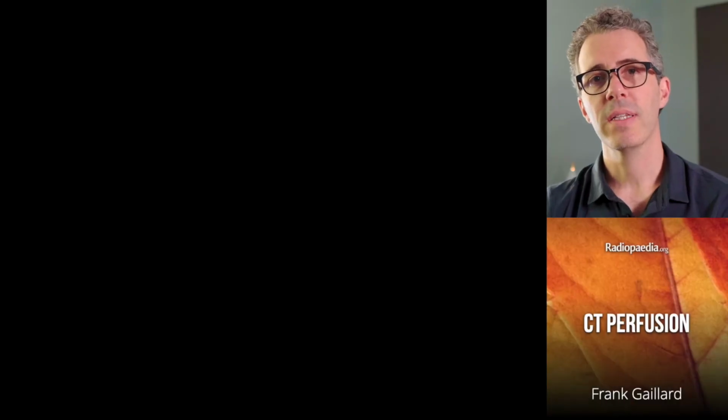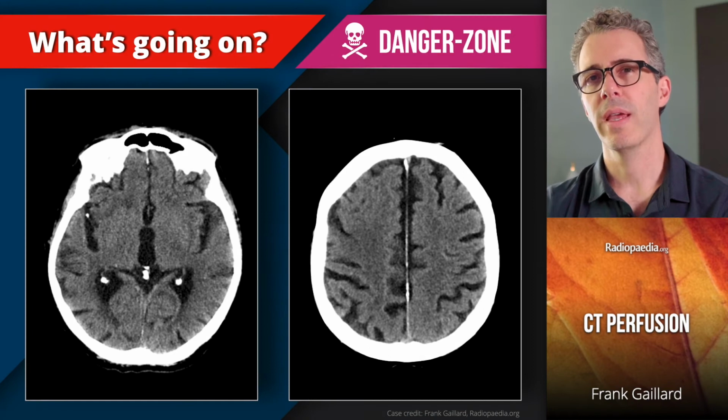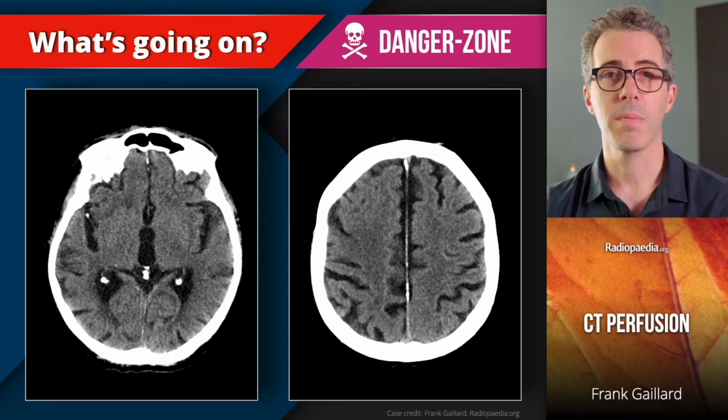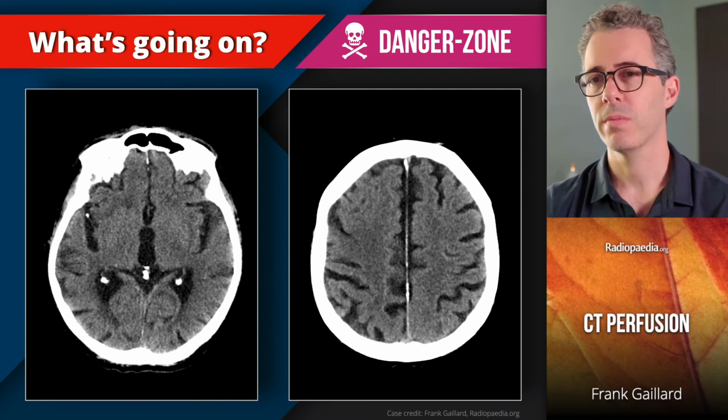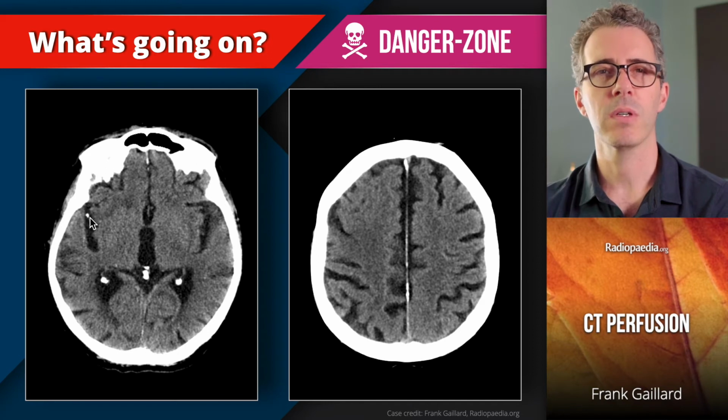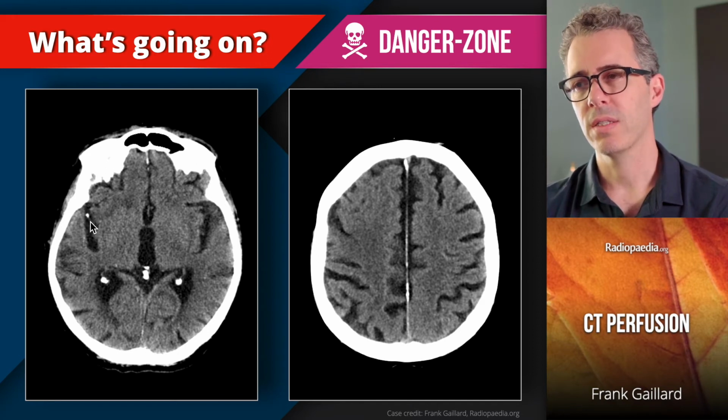And before we finish, let's have one other case where we can see some of the pitfalls of relying too heavily on automated perfusion interpretation. In this instance, we have a calcific embolus here in the middle cerebral artery branch on the right in the Sylvian fissure.